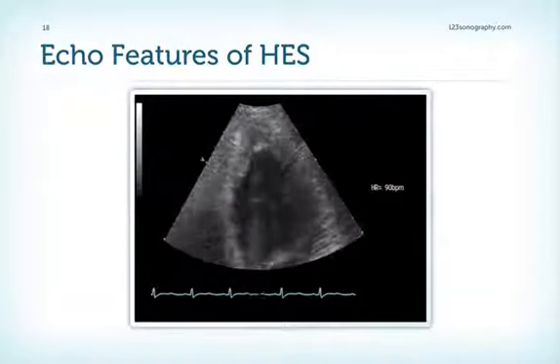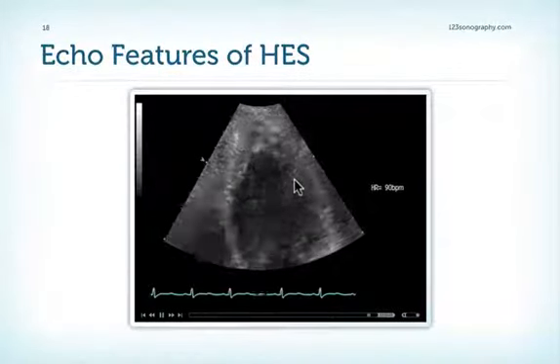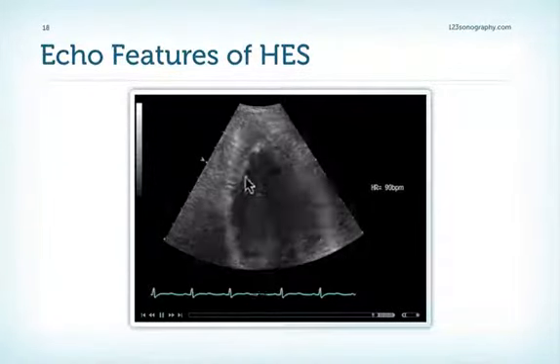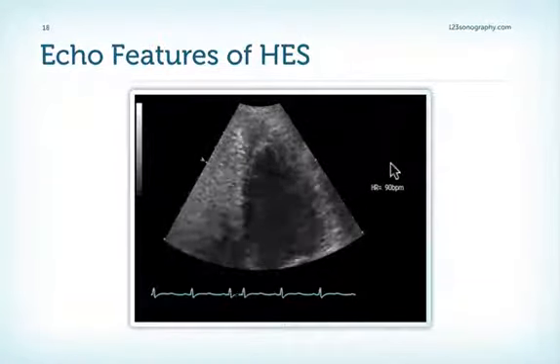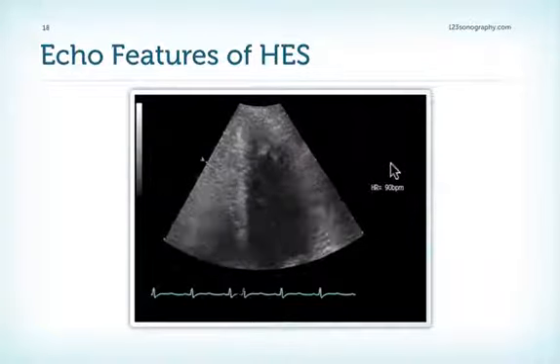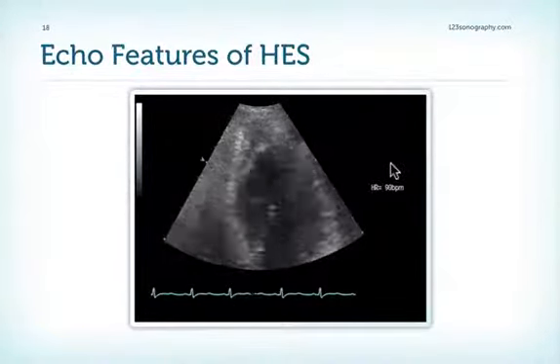So this is actually the same patient you just saw only 3 years earlier. You can see that the patient at that time had even more infiltrates in the apex. They're just not as echogenic as they are in the demonstration. And the patient received monoclonal antibody treatment after that and responded quite nicely also with respect to his eosinophils.